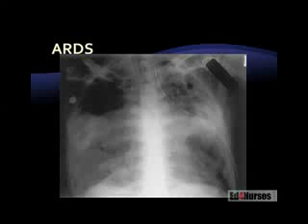You see just kind of a whiteout on the chest x-ray going on from top to bottom. Again, a PA picture. You notice you don't see the heart very well because we're looking from the back toward the front. What is going on there in the upper left-hand part of your screen? Interesting, isn't it? Big black hole, that should be a big black thing that should be air there, right? Except, notice, you see that little white line going through there? That's one of your EKG leads. That's missing too. This is a defect on our chest x-ray.